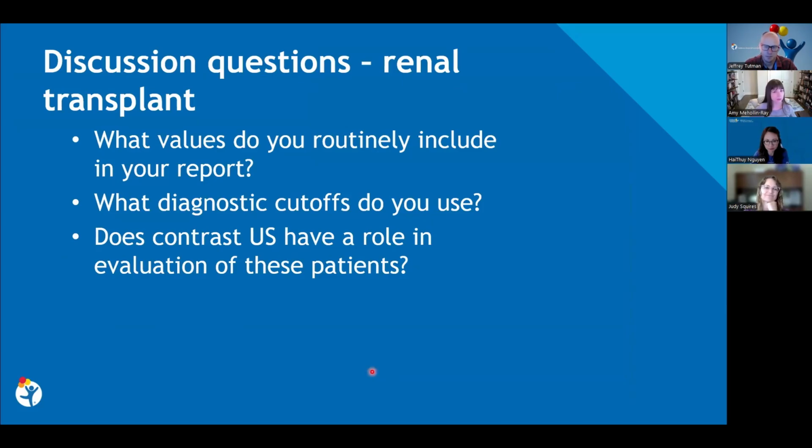And so they are likely to have the ostial type stenosis that we're used to looking for in adults. So to me, this is a great application of renal Doppler in transplants, because our exam is designed to detect a stenosis where they're likely to have one, in contradistinction to the average pediatric patient with native kidneys, where it could be branch or accessory or whatever.